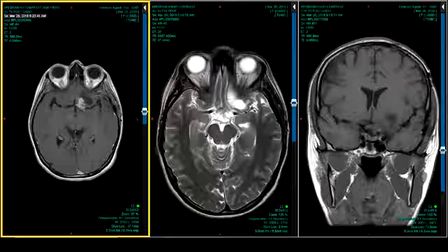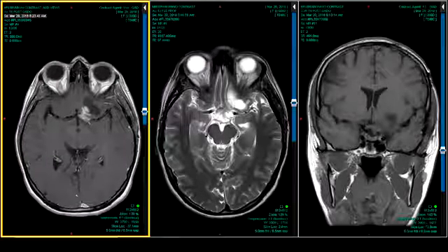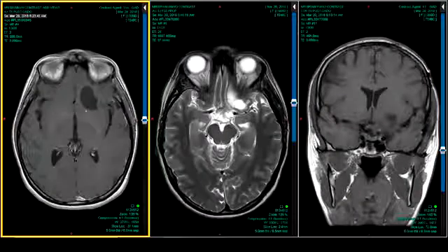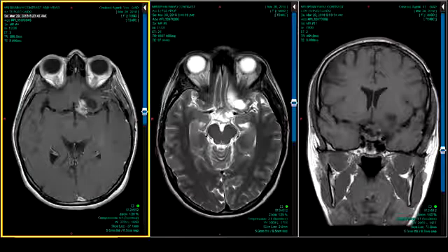Okay, so you're used to seeing a cerebellar hemispheric cystic mass in a young person with a mural nodule, right? Nobody would have trouble with that, and that's a tumor that behaves very well. People do really well with that. You can peel it out.